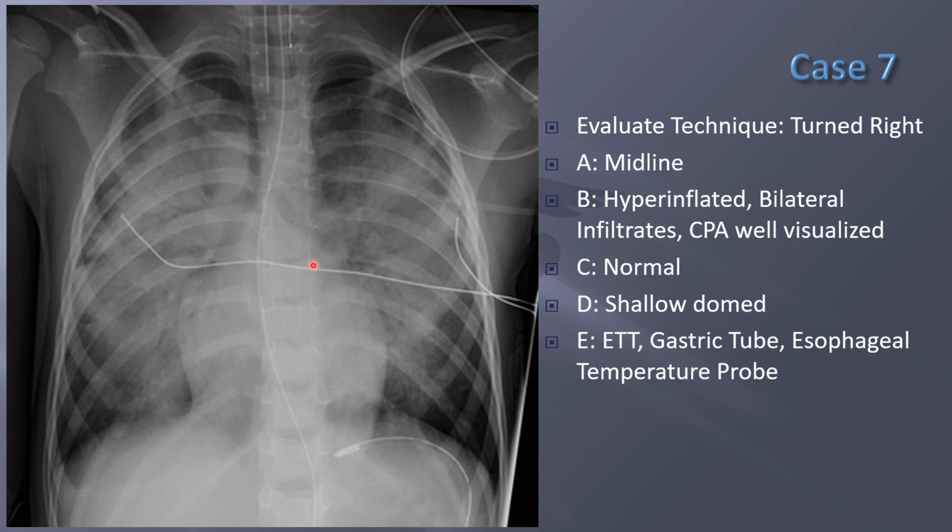It's not going to mean much to our overall diagnosis of this patient, but we just want to know that maybe this deviated trachea is probably normal because the film is slightly rotated. I don't think there's any pathologic process forcing the trachea over there.